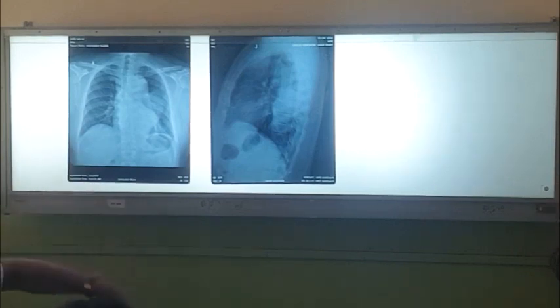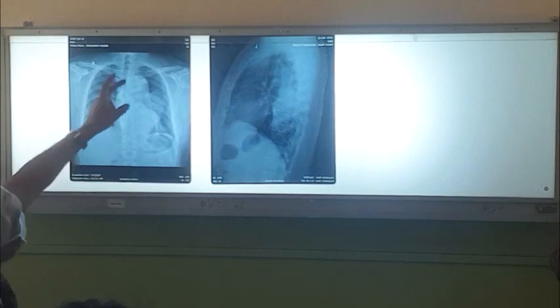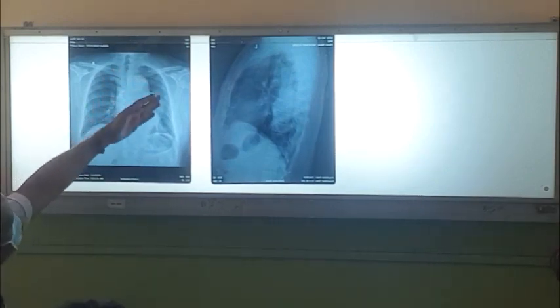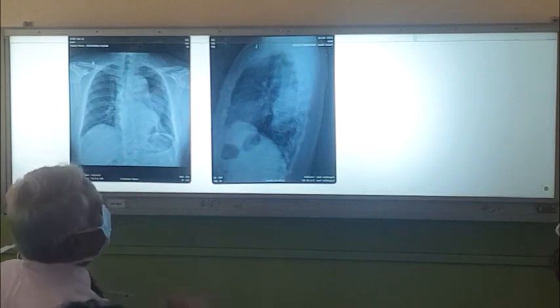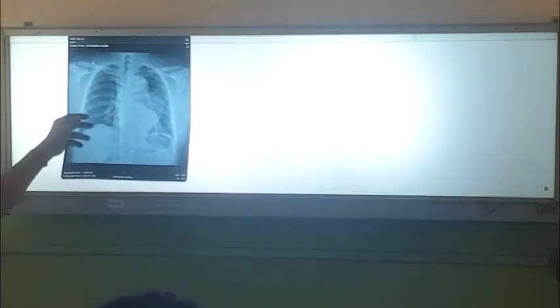So this is a patient with dissecting aorta. If you take the history, few words, that is enough. Then you look for dissecting aneurysm here. So this is a very big aorta, and from here it is going like this. So bulging, leaking aortic aneurysm. So this is a leaking aortic aneurysm here. So in its CT it was leaking and bulging, dissecting aortic aneurysm. So history is very important.